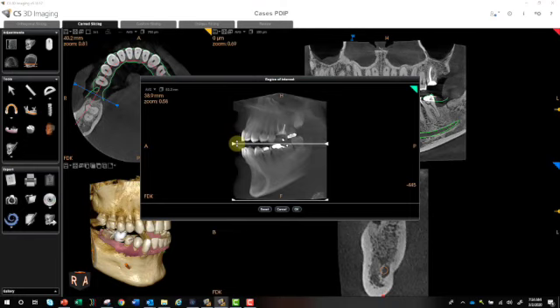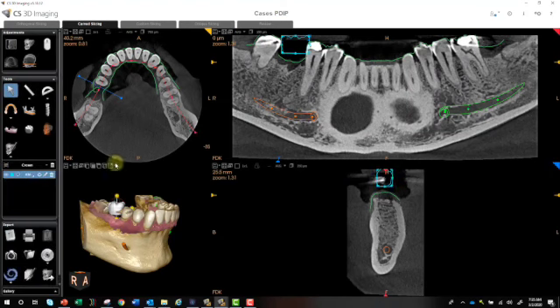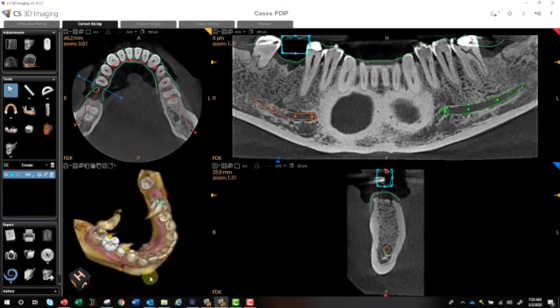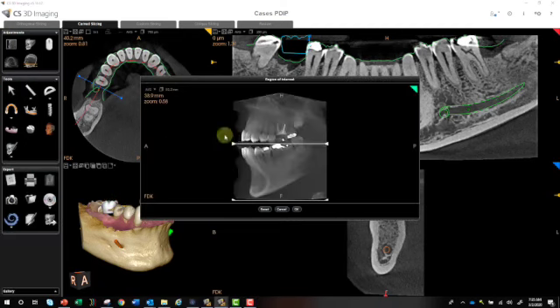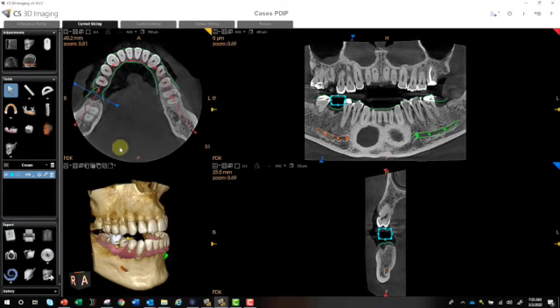But you can see here it's also on this plane, so we're cutting off a little bit of the crowns in the posterior here. Select OK, and it crops out the entire image, all your slice views, and your 3D rendering, and I can visualize things a little bit better that way. So that's one way. Let's put this back.